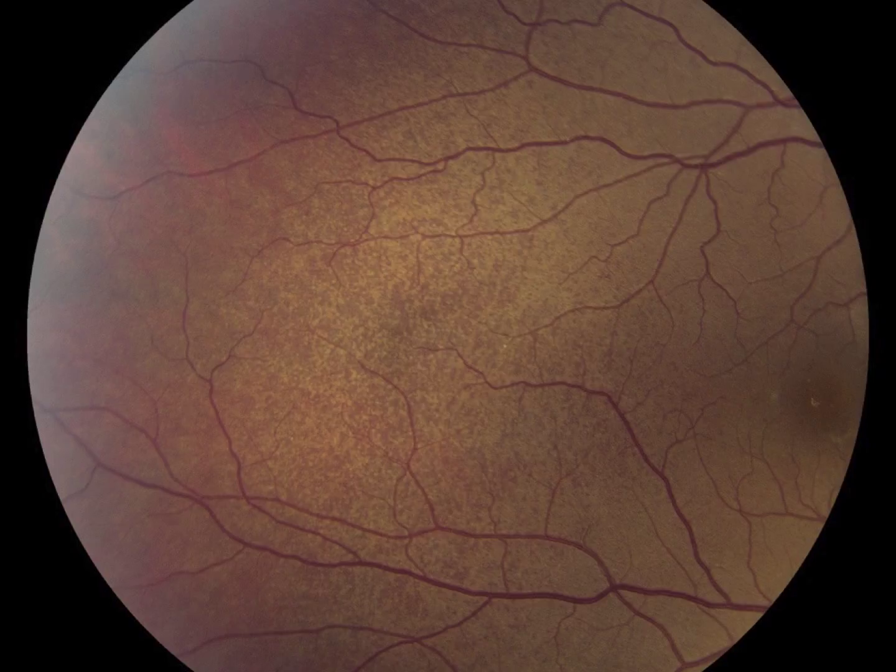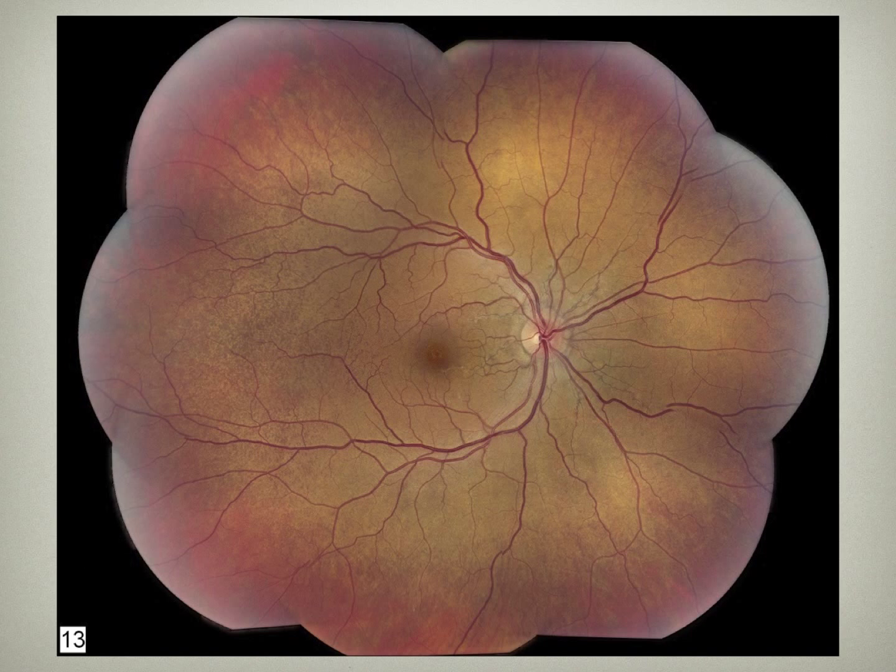So I'm going to show you the next image. These little dots, if I could convince you, are actually yellow dots, and the reddish portion, more temporal, is normal. Yeah, okay. So what you're seeing is this kind of, I wouldn't say pale yellow, but this kind of orangish color. And this particular transition zone between the orangish color and the reddish color has a very specific name for a person with this syndrome. It's in French, and it's peau d'orange. Good. So it's that orange peel appearance.